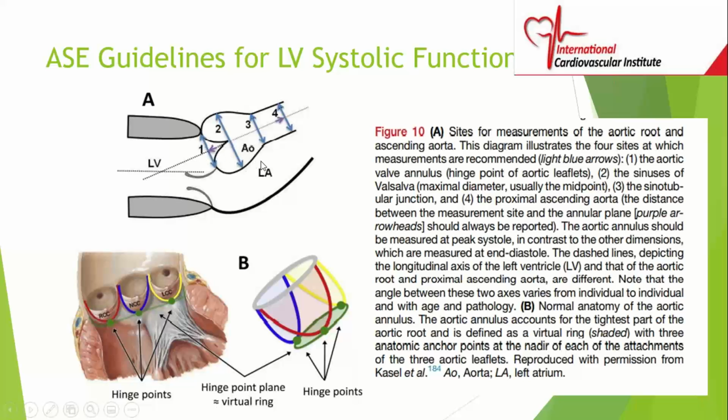So when we talk about the aortic plane, this line runs parallel to the wall of the aorta. So that is your aortic plane, and your measurements should be perpendicular to this plane.